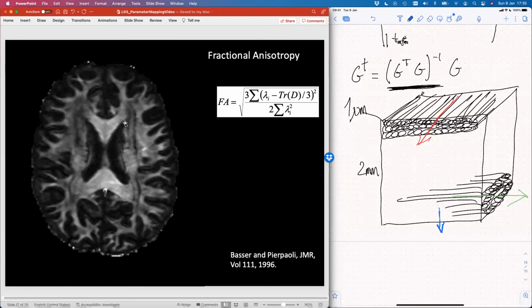And you can see here that this map picks out areas of white matter. These two V sort of arrow shapes here are once again the corpus callosum. We get high values of the fractional anisotropy, as we see in various other white matter regions, whereas in the ventricles, the CSF regions, and various bits of grey matter, you see much lower values of the anisotropy because there's more isotropic diffusion. And again, this can highlight interesting pathologies.